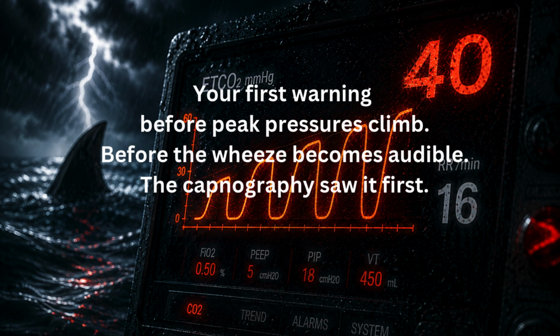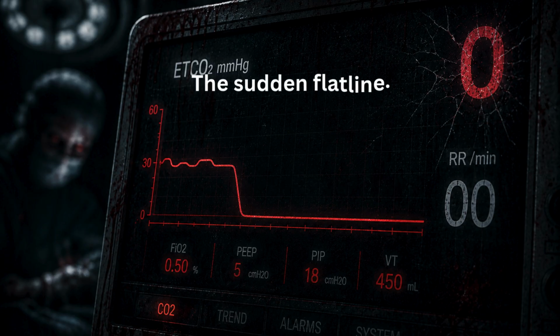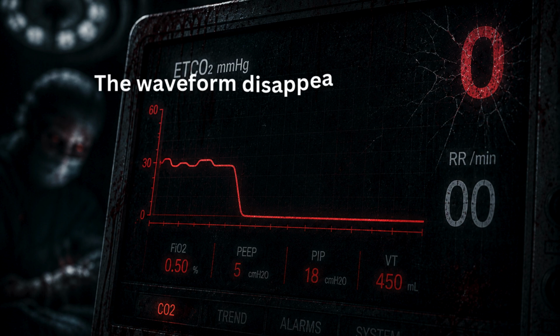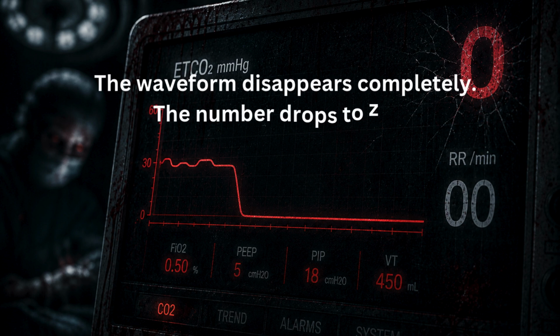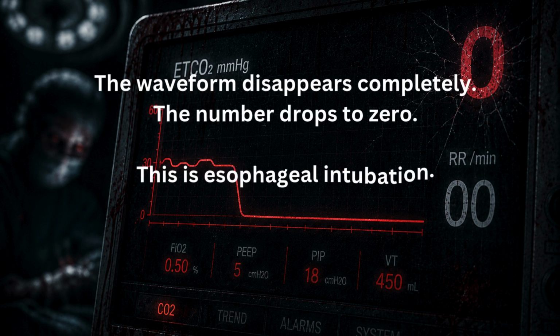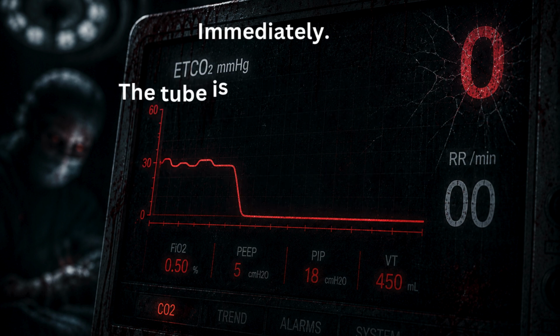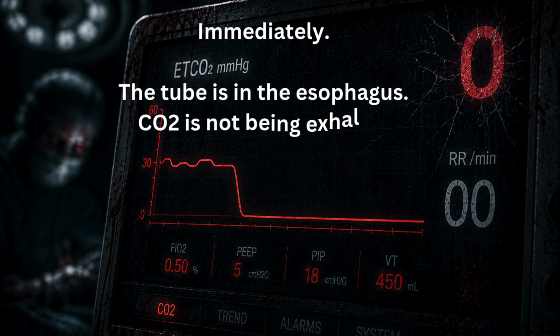The capnography saw it first. The sudden flat line. One breath, normal. Next breath, nothing. The waveform disappears completely. The number drops to 0. This is esophageal intubation, until proven otherwise. Immediately, the tube is in the esophagus.